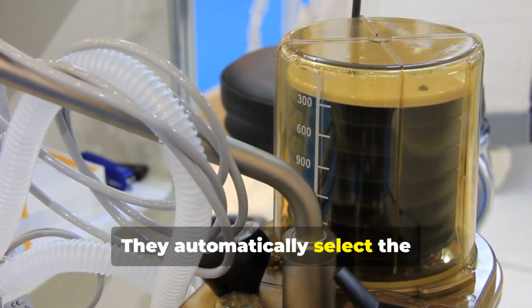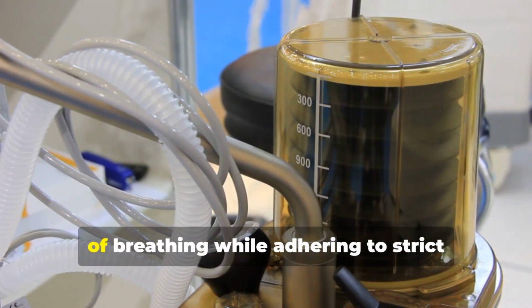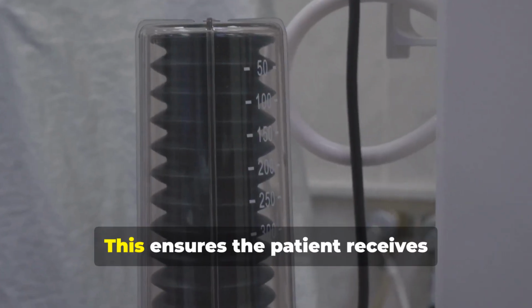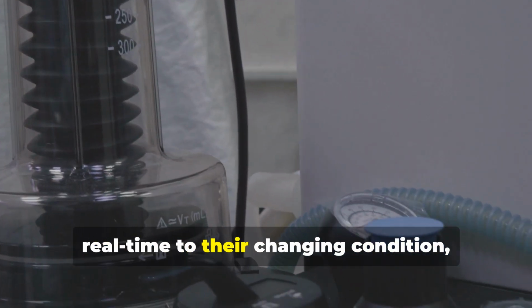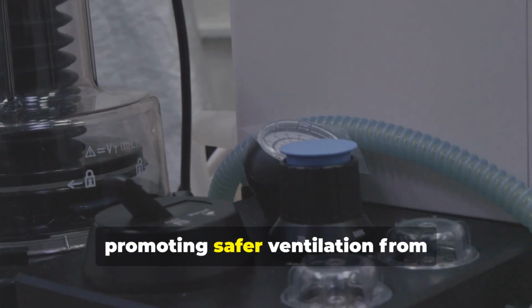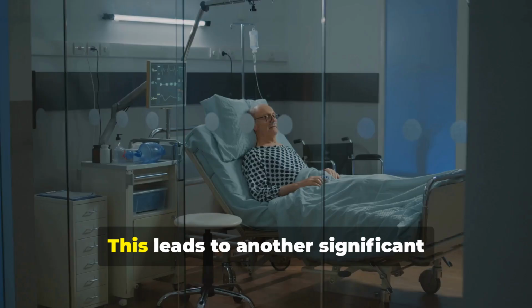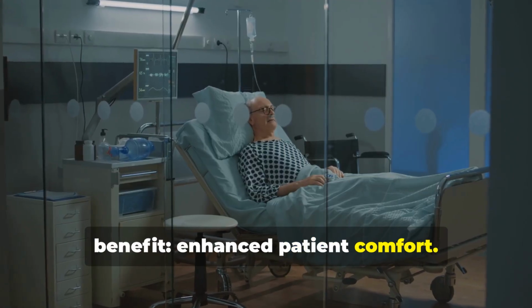They automatically select the combination of tidal volume and respiratory rate that minimizes the work of breathing while adhering to strict lung protective rules. This ensures the patient receives tailored support that adapts in real time to their changing condition, promoting safer ventilation from intubation through to extubation. This leads to another significant benefit: enhanced patient comfort.